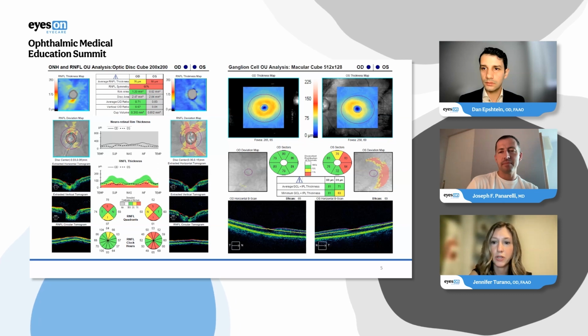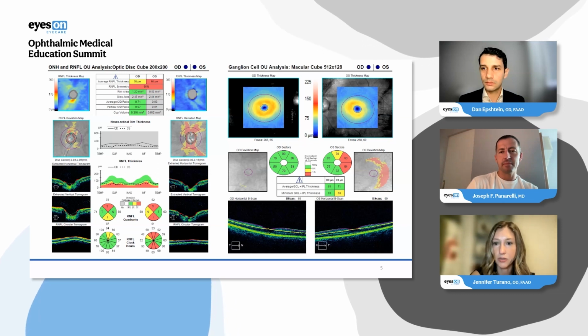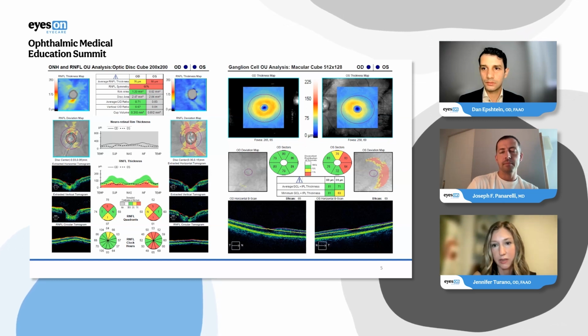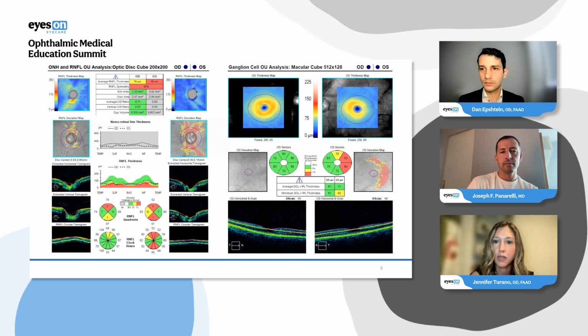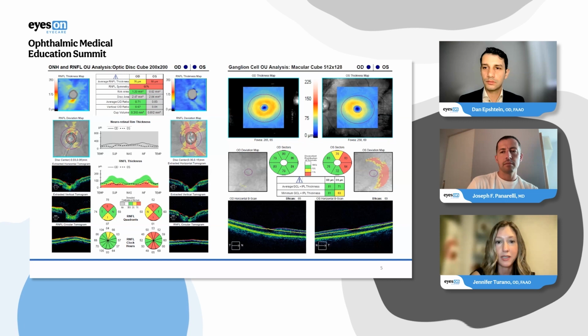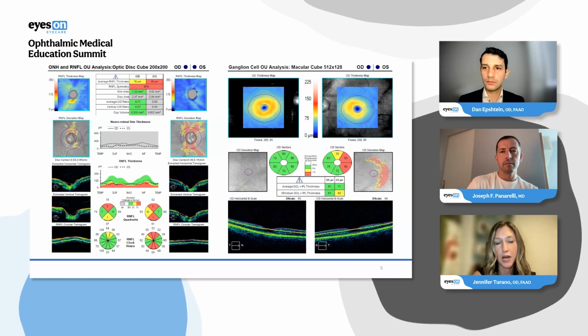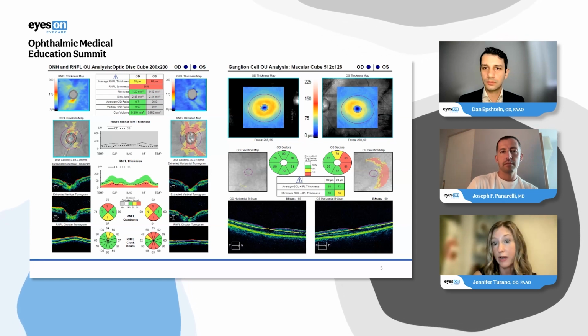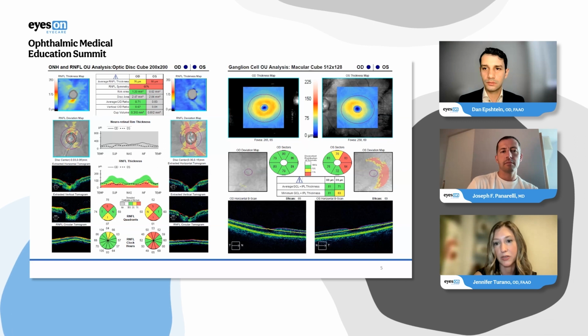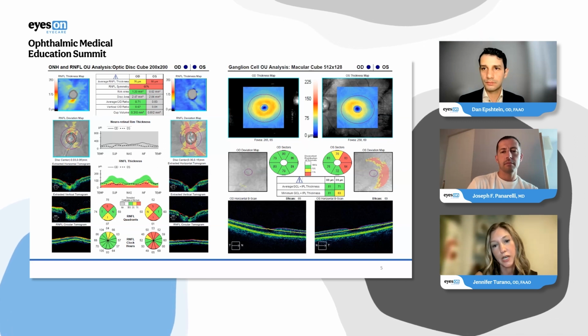Yeah, certainly. One of the questions to consider would be what's the signal strength on the scans in this eye, but looking at the reflectance of those scans, it looks pretty good. So I think this is good data that we're dealing with. A lot of times when we look at GCC, my other question would be, is there anything else going on in the retina to cause change? There may be a mild ERM that's skewing the data here. So that would be my first question.